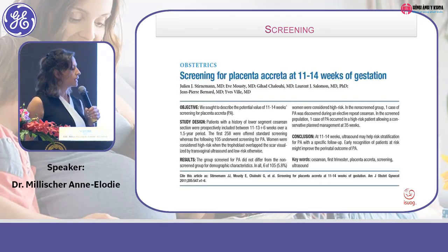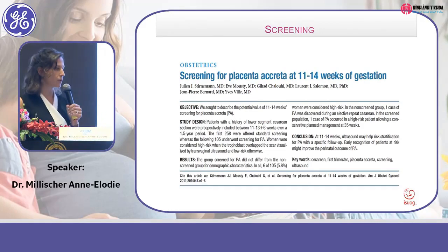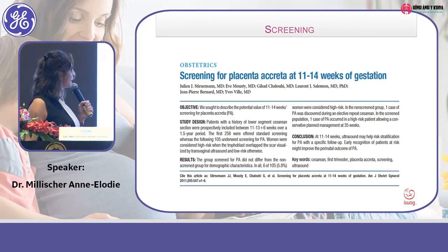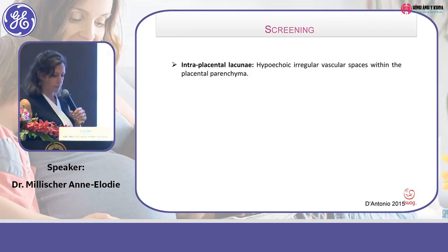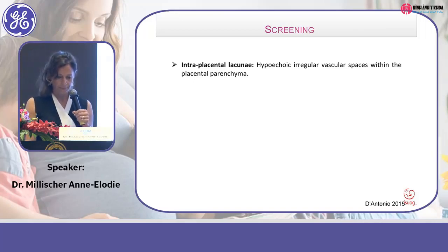Early in pregnancy, we can suspect the presence of morbidly adherent placenta regarding the aspect of the scar, the location of the scar related to the internal orifice. And if you have this kind of placental insertion, you could be sure that it developed placenta accreta. Và khi mà các bạn gặp một cái trường hợp mà trên siêu âm mình thấy là có một cái sẹo mổ lấy thai từ trước, và có một cái nhau bám thấp thì khả năng cao nó sẽ dẫn tới một cái nhau cài răng lược.